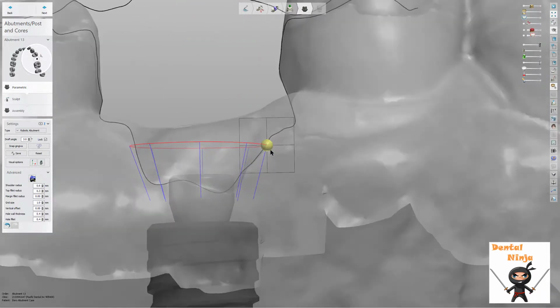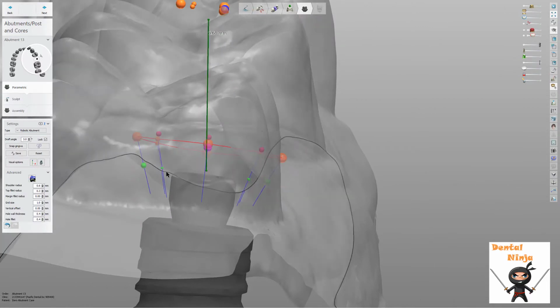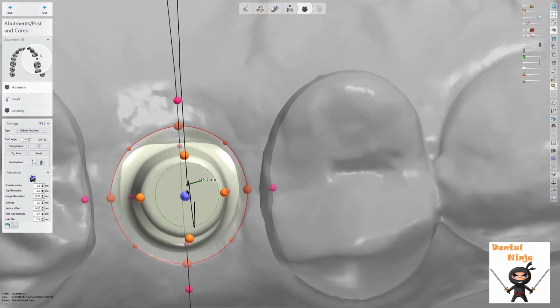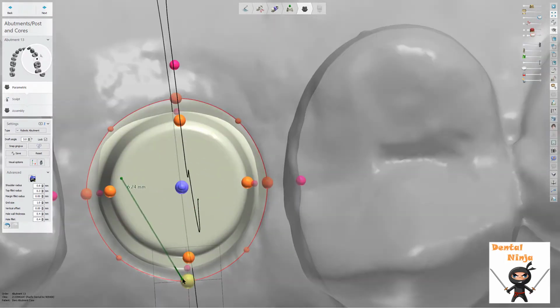and move on with it. Now, if you do have a doctor and he likes listening to your feedback on how to do it, have him scan the pre-op as the abutment alignment scan, as you know, for your tissue mark. Take the scan body off and scan it as a pre-op. That you can do.